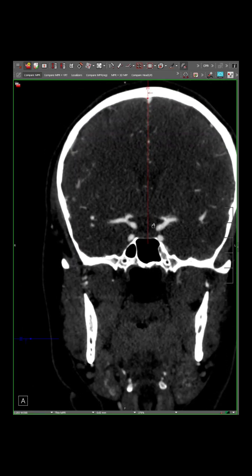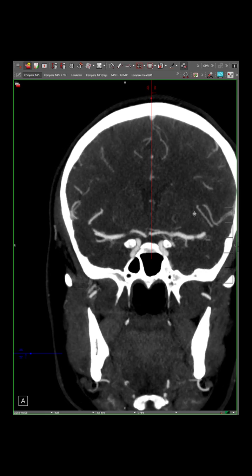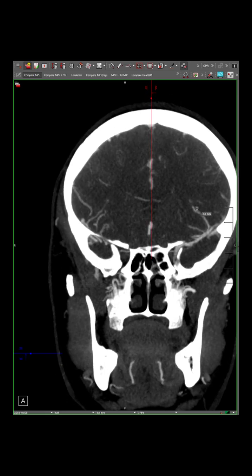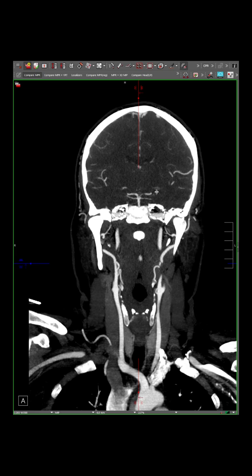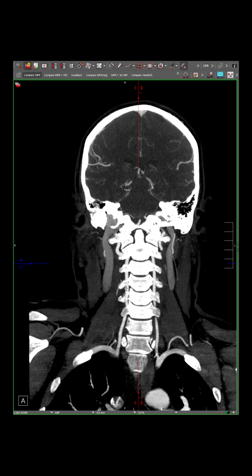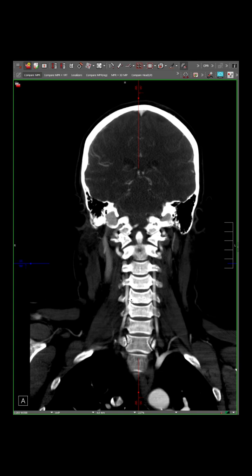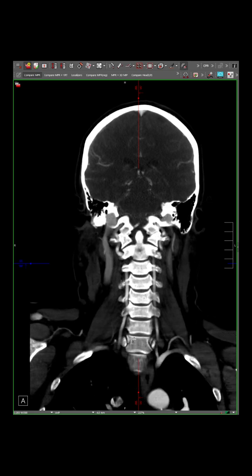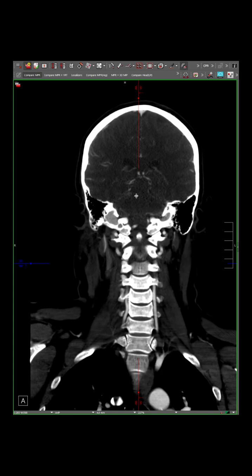And then as you get up into the intracranial compartment, you can make the slice thickness larger, and follow those arteries in a more efficient manner, right? And similarly, in some areas, for example the vertebral artery V2 segment, you might want to use the average intensity projection to be able to account for some of that complexity.